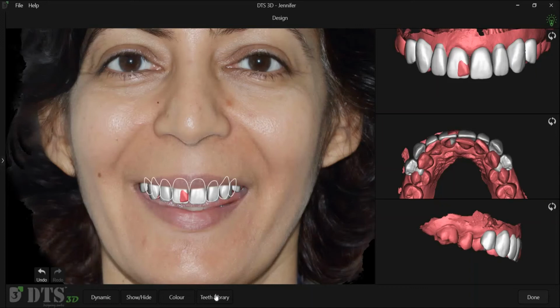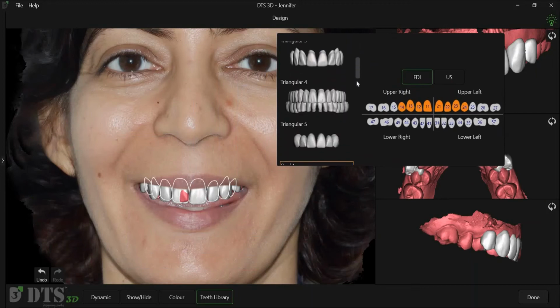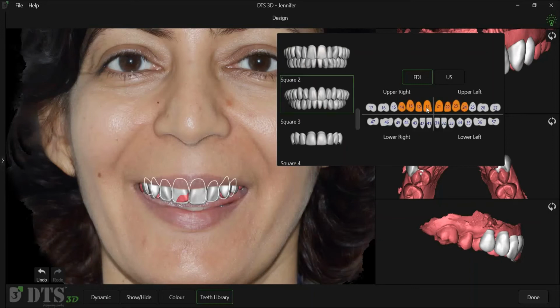Once you have changed the position of teeth shells, and if you open the tooth library box again, if you now want to add a different library, it will be added in the position that is fixed for the earlier library. So now the position of teeth shells is fixed, and you can easily navigate between different teeth shapes and sizes.